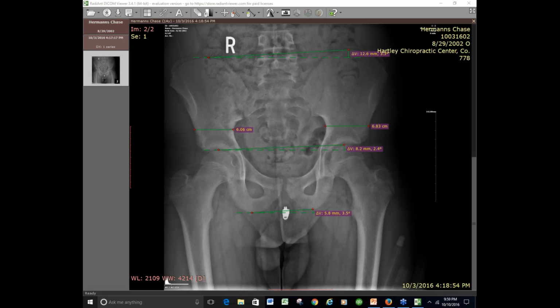And then, if through your therapy and walking around and doing all these things, he's able to correct some of that knock-kneedness and it starts to correct, you might have to adjust your lift. Does that make sense? You have to meet them where they are. This is where he is and this is what he can do, so I need to correct to that, because what are we really trying to do? We're trying to get the spine as straight as possible, and the hips as level as possible.